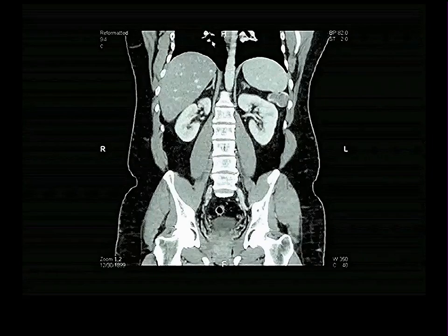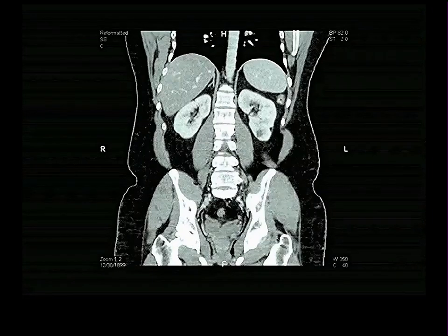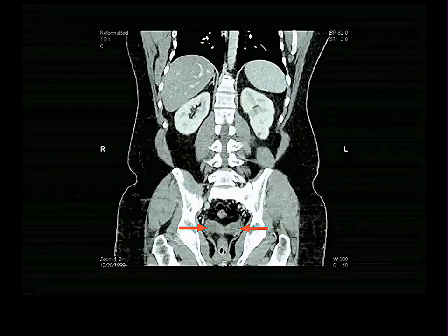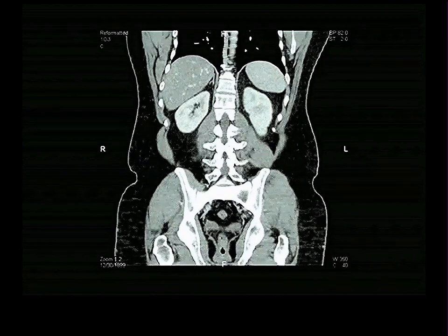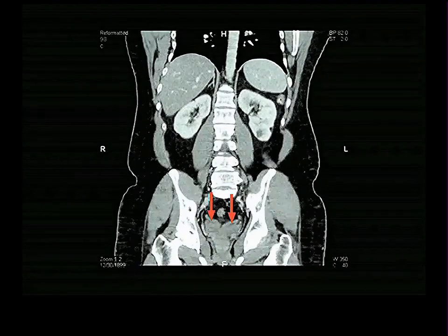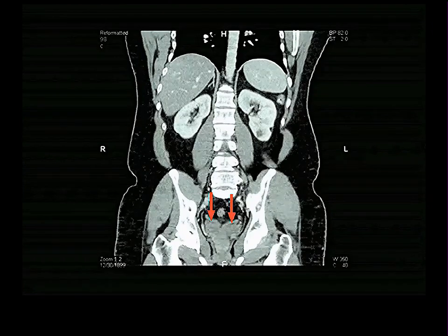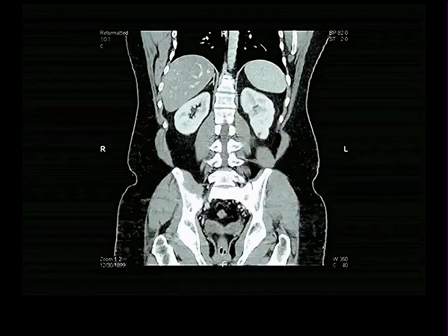We're eventually in the region behind the bladder, and yes, indeed. Now we see the things behind the bladder, the two bow tie things, the seminal vesicles, which are behind the bladder, and then we'll come to rectum. Oops, well, that was rectum there. Let me go forward. I thought I saw even, oh, look at that. That's what these things are. These are vas deferens right here. Right there. And they're going to run down there between the two seminal vesicles.